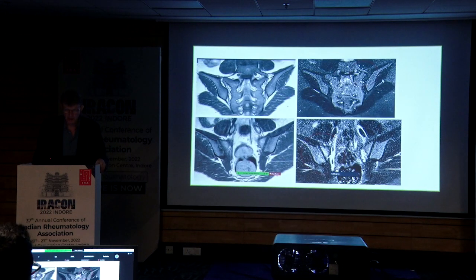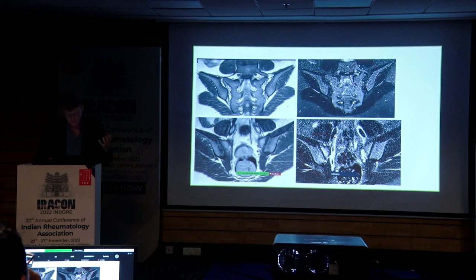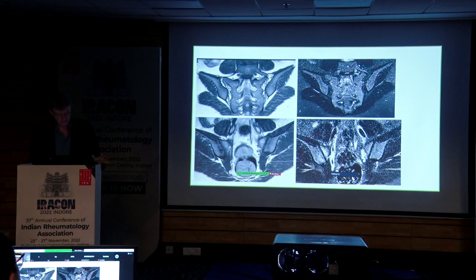This is an example of a patient who has this lumbosacral transition anomaly there with the processus transversus and the sacrum forming a joint. And then in the same patient, there was some bone marrow edema on the other side. And there were no signs of it being axial SPA, so you may see that kind of thing in your patients, and you shouldn't overinterpret it.